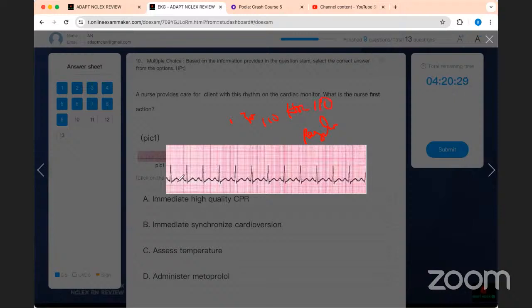And then I see T wave and P wave. Look at this. I want you to pay attention to this carefully. You see how they're close to each other, but you can see T and you can see P. All of them. You can see P and T. It's not that the P and T are together. If the P and T are together, it's SVT. But if you can see them distinct, but they're close to each other, it cannot be SVT, right? So this is sinus tachycardia.